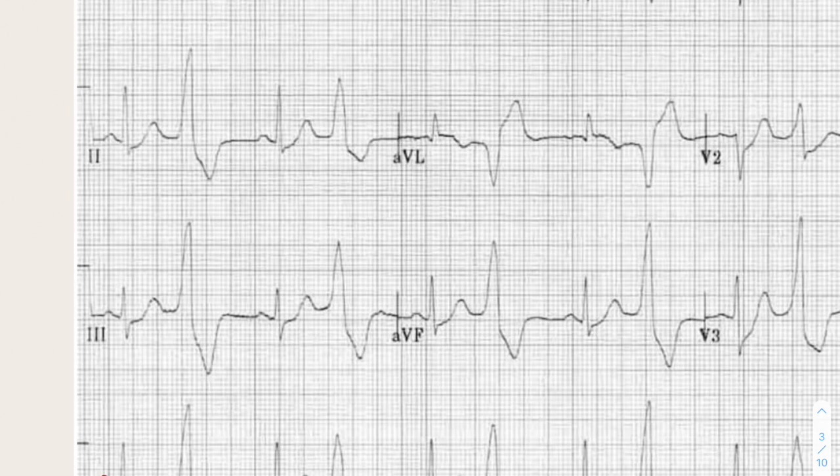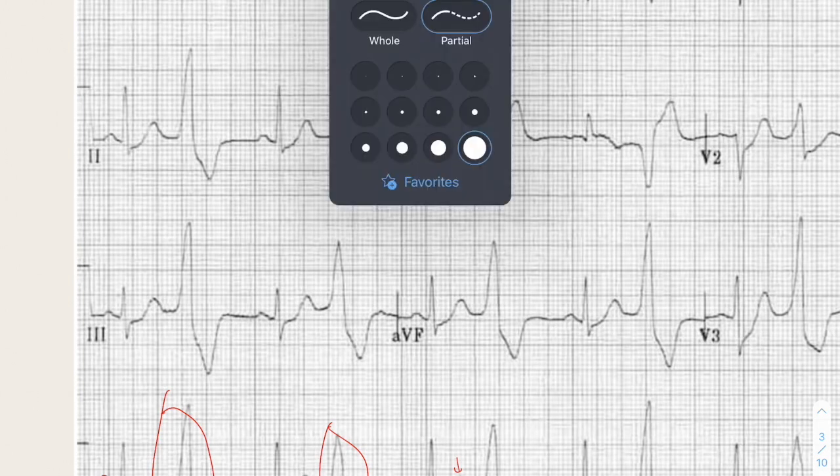But you're obviously seeing that there's something going on here that looks like a QRS complex, but does not have a P wave before it. For instance, this one is here, but there's no P wave before it. This is the T wave, actually, of the previous tracing. So that is our abnormality there. But you would say, yes, you have P waves, and where there is normal conduction, there is a QRS that follows.